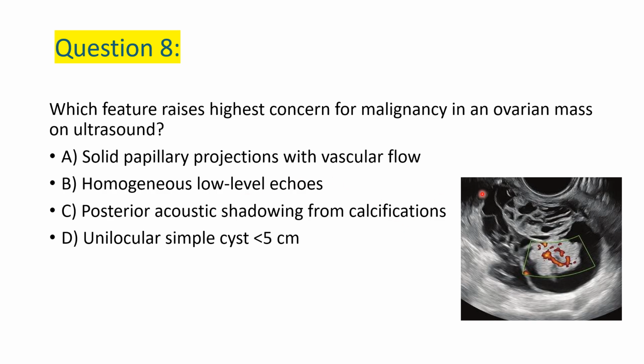So the correct answer is, if you see a cystic lesion in the ovary with internal flow and solid components, that is highly suggestive of malignancy, which is cancer. So the correct answer is solid papillary projections with vascular flow. That's our correct answer, A.